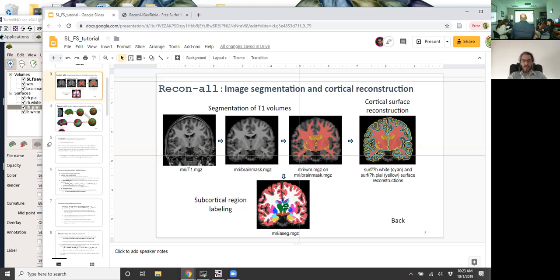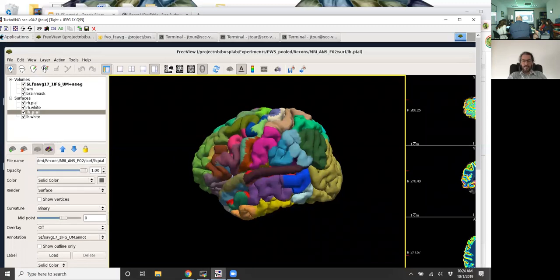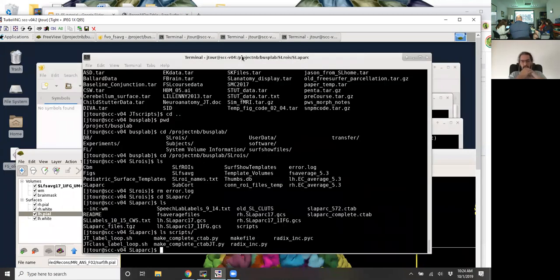Like I was saying before, usually that's fairly simple. We can look at a color table, there's no reason I can't show you what these things look like. Let's go find a color table.